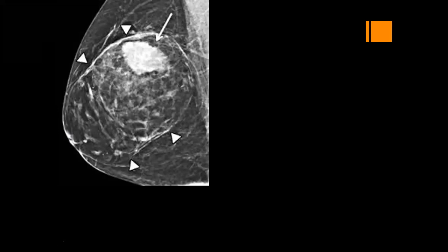Well done. Is there fat containing or no fat containing? This large lesion contains fat, but how can you explain this? A malignant mass, it is dense and with spiculation. Yes, you have a spiculated mass within a fat containing mass.